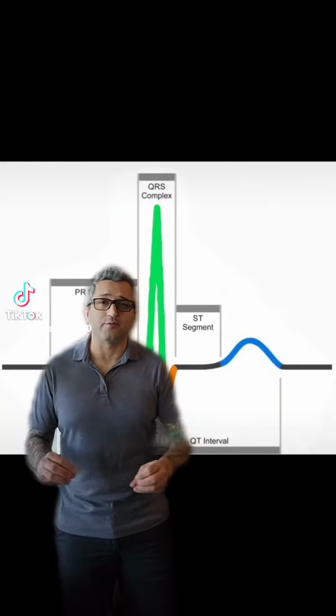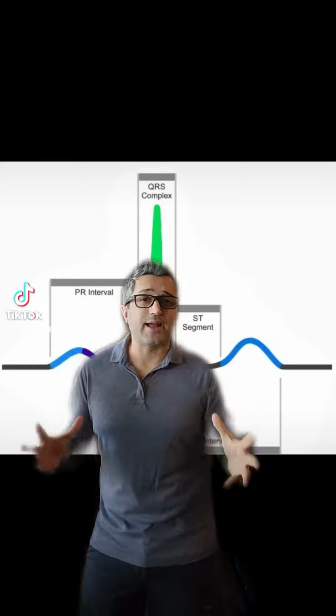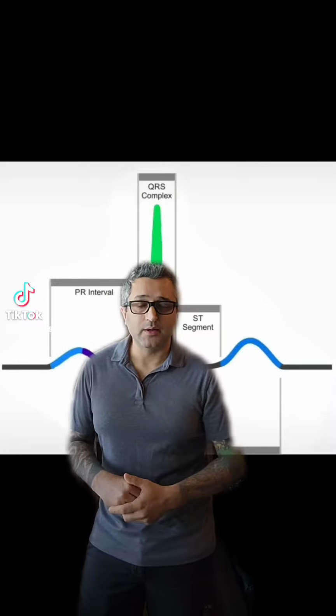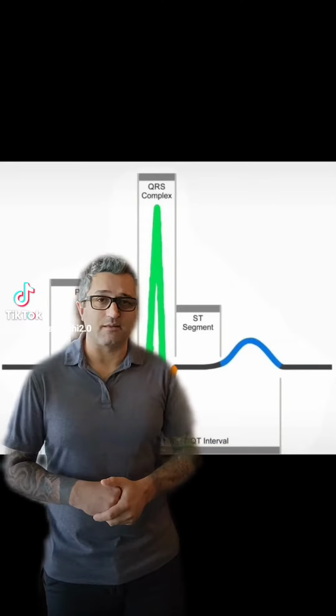It is also critical for you to understand that every time you are looking at this photo, you're looking at a cardiac event through lead 2. This cardiac cycle would look different depending on what lead is being used.